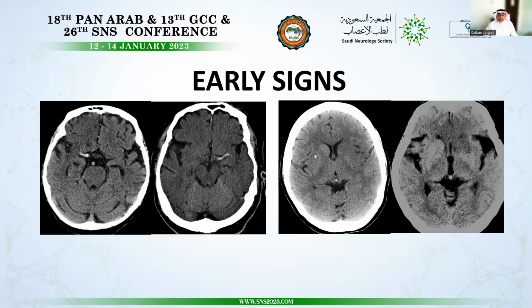You also identify that the sylvian fissure is smaller in size, and the insular ribbon, which is usually outlined by the insular cortex with the underlying external capsule, has been lost. So you've got the vanishing or disappearing basal ganglia and the loss of the insular ribbon. These findings are of early infarction, secondary to the presence of a thrombus or an occlusion in the feeding artery.